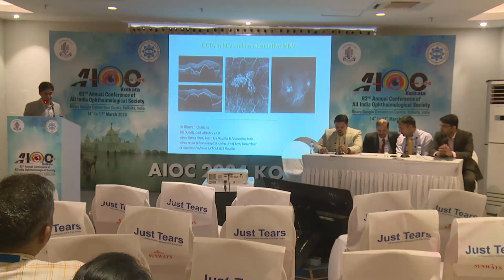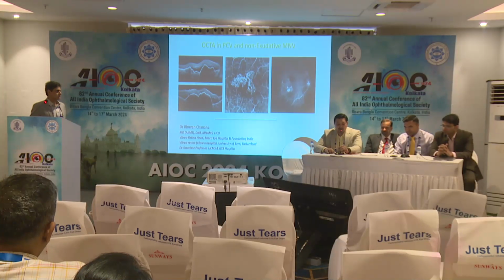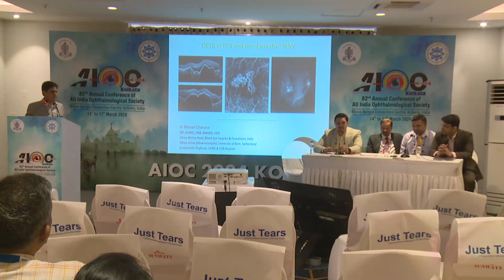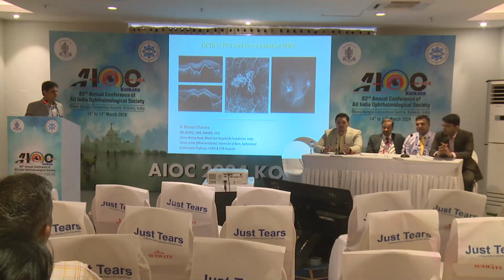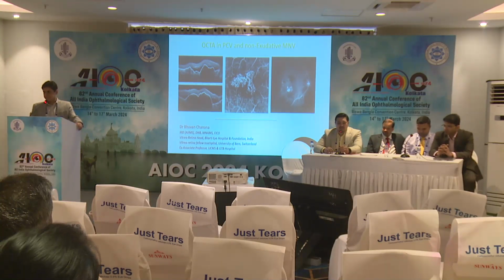So now I go to another very important topic, which is IPCV. IPCV has always been in the domain of ICG, and there is a new terminology which has come in recent years, non-leaky MNVs, which have been evidently shown on OCTA. Before that, we didn't know much about these entities.